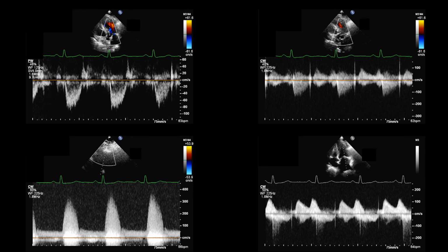And if we examine the spectral Doppler again, we can see that from the apical window, the transvalvular gradient is actually quite low with no significant stenosis, and this is in agreement with the 2D pictures. So the unusual aspect is the high velocity obtained from the suprasternal window. Now, what could account for that?